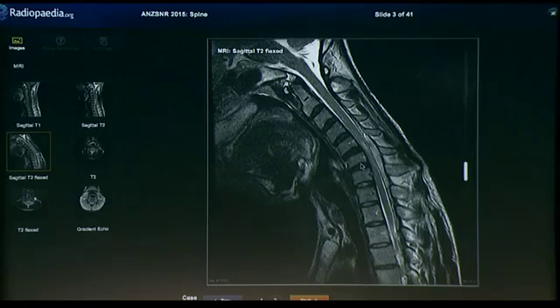So if you do an MRI scan in a position of flexion, what you can see is that the posterior dura has migrated anteriorly. There's a pseudomass behind it, which basically is the engorged posterior epidural space with a lot of prominent flow voids, so that is due to passive engorgement of venous plexus.